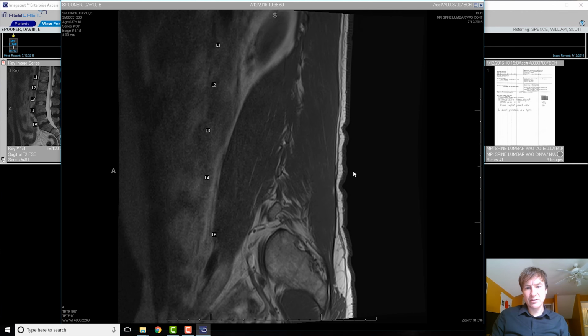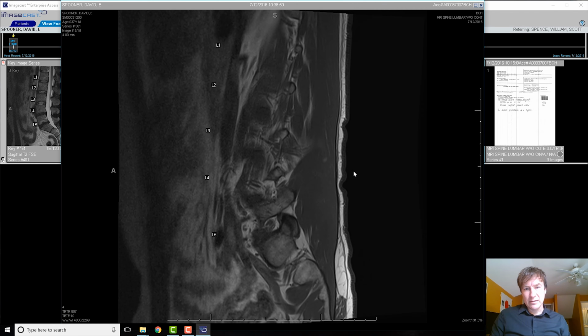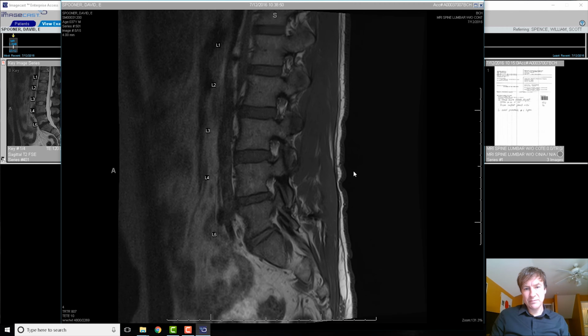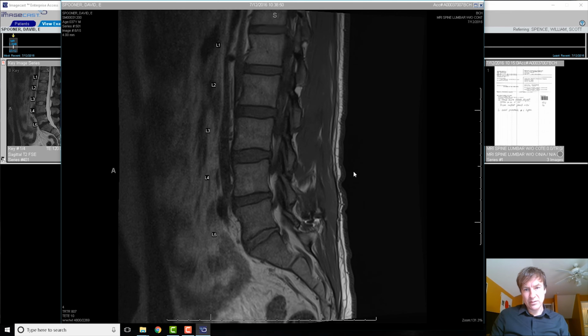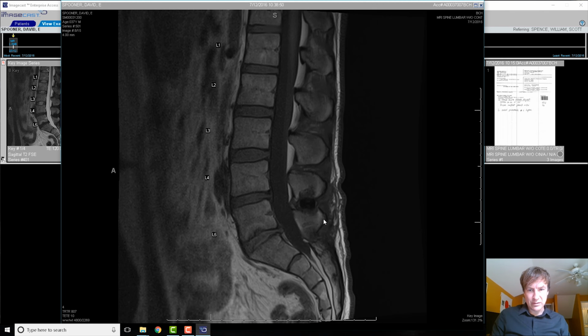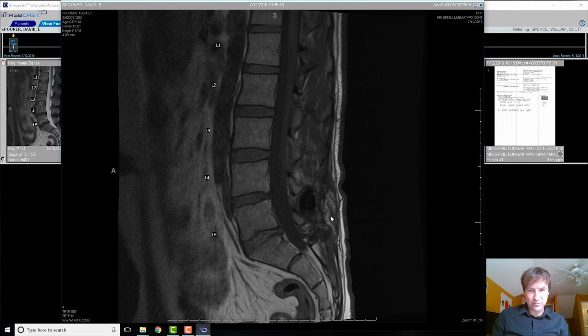As we progress, from the right side of my body to the left side, you can start seeing what's going on. As you can see, there's scar tissue here. This is the outer layer of my skin. A lot of mass from the surgeries, the last two surgeries here. Scar tissue.